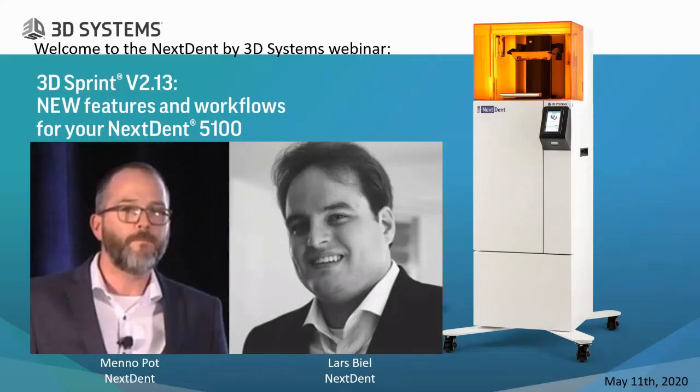We will kick this webinar off with Menno Pot, our Senior Application Specialist at NextDent, who will demonstrate the 3D Sprint version 2.13 update. At the same time, we have Lars Biel, also Application Specialist at NextDent at our training center in Soesterberg in the Netherlands, who will show you live the impact of the changes in 3D Sprint on the printed parts.